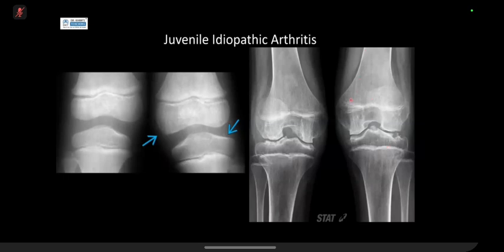Patient has these long gracile bones, flaring of the metaphyses and epiphysis with osteopenia, erosions, and all of this, and the joint space narrowing. So remember, in inflammatory pathologies, even in kids, your joint space narrowing is diffuse because the joint is coated by synovium that's inflamed, versus in an older patient where osteoarthritis is quite focal because it's in the weight-bearing aspects. Okay, so inflammatory diseases affecting the joints often give you diffuse joint space narrowing and not focal.